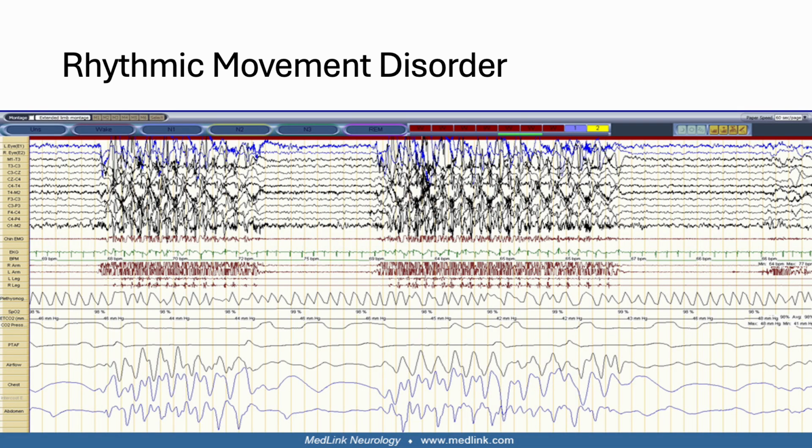This kind of looks like head rolling. It looks like the EEG is going down and up and down and up and down and up, from extreme upward to extreme downward. And that would mimic the patient rolling side to side. It looks like they're also tensing the legs or rolling their whole body there. Check out those respiratory belts. It's going crazy because of all the movements.